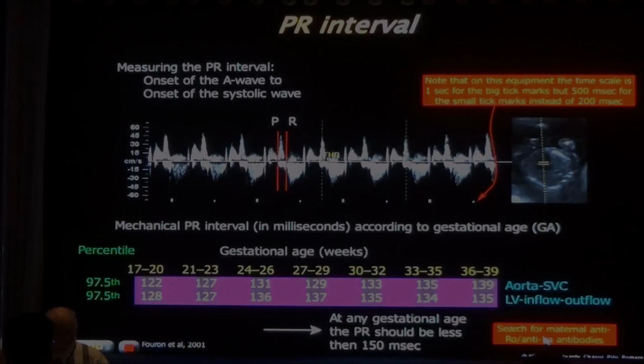So unfortunately, I'm out of time here. But I really would like to urge you to download this lecture and go over it several times until you have all this information. It's very practical, very step-by-step. You will not become a fetal echocardiologist after the lecture, but you will be able to do a lot of good for your patient. You will certainly be able to recognize what is a normal baby from a baby that needs to go to the tertiary center.